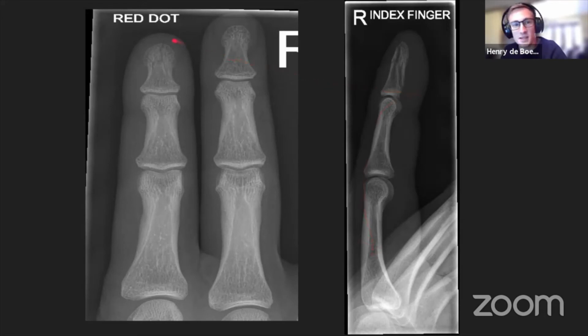Red dot. In most centres, and particularly in Sheffield, when the radiographers take the films, if they think there's an acute abnormality, they'll put this red dot on the film. Some have a red circle that appears. They'll write red dot if they think they can see a fracture.